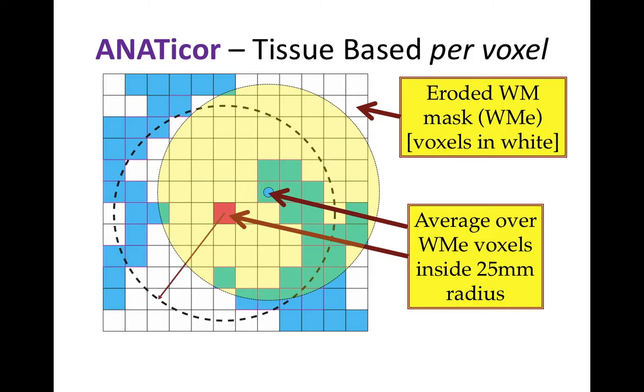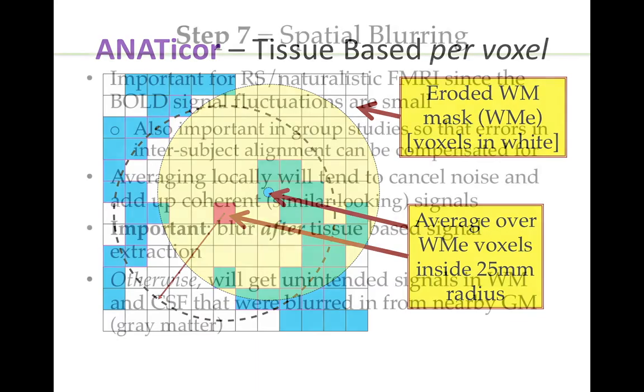This is done in AFNI, so this is a place where the X matrix is pretty much the same for every voxel except for this one column, which will be different for every voxel. In AFNI, we can do this because the programs that are written for regression are written to be very efficient, and so it makes the analysis still feasible to carry out even on hundreds of thousands of voxels to have a different matrix in every voxel.